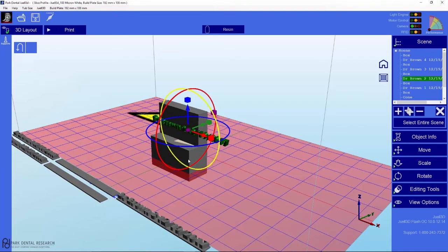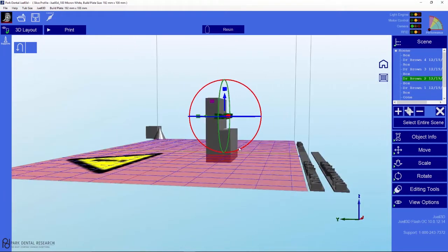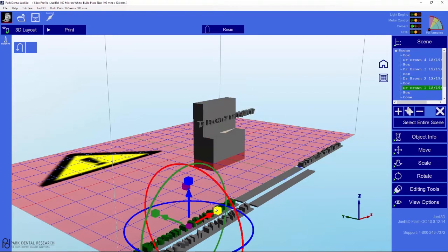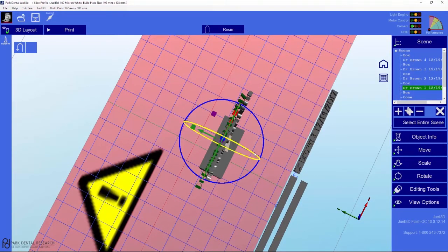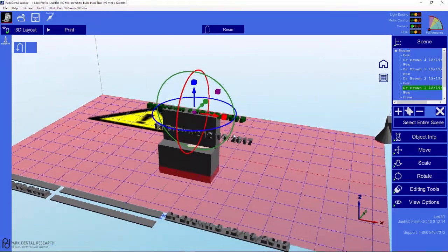So I just took this lettering and put it on the model by right clicking the model. So you select the label that you want, double click, you go to your model and you select the area on the model that you want to place this. So I'm going to rotate my model and double click, and it just brought it over and automatically puts it on the model in that spot.